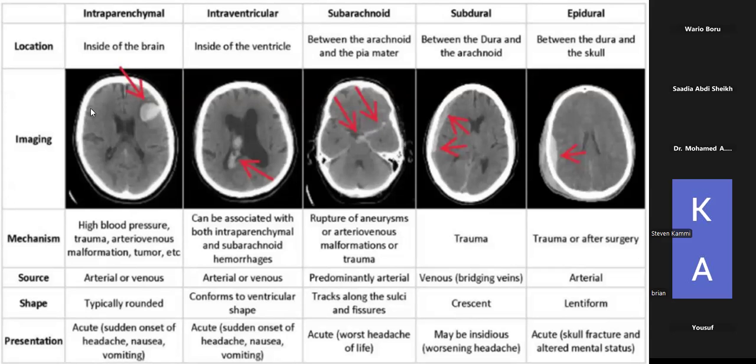Yeah, so this is an axial view. Here you can't tell the temporal lobe. Most likely the temporal lobe would be much lower, here as an example. This is the middle cranial fossa. So this is the temporal lobe that's occupying here. This is at a higher level. In this cut, you can see the temporal lobe, the cerebellum and the fourth ventricle. You can see the mastoid sinuses. This is the temporal bone, which you can see separates the middle cranial fossa from the posterior cranial fossa. I hope I've answered you.